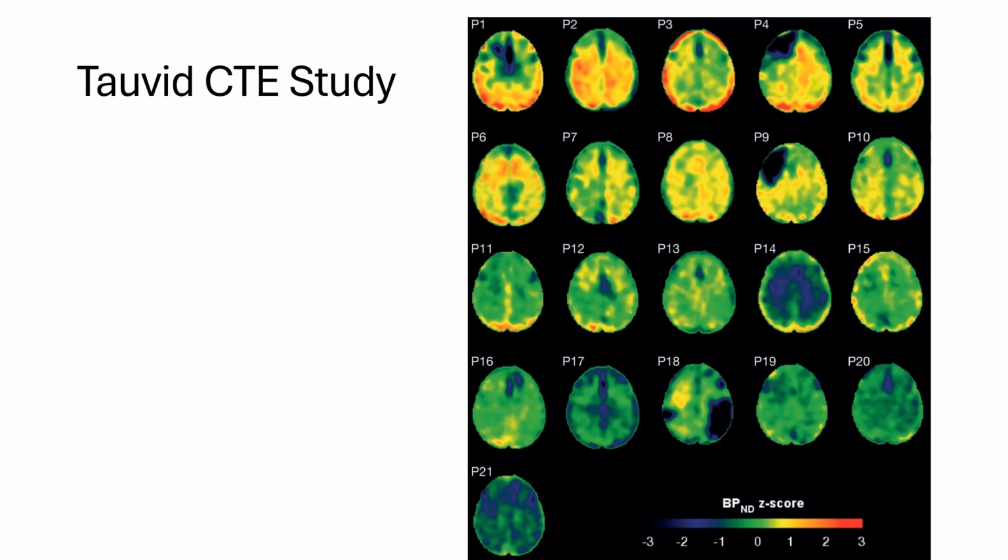This is an example of how tau can also be used to study CTE. Although this is not widely accepted, this is an emerging science with all of these rare and emerging neurologic applications. But this is a patient who has had multiple injuries, and the tau protein is being used to assess any kind of chronic damage that has occurred. And you can see that any accumulation of the tau is abnormal.